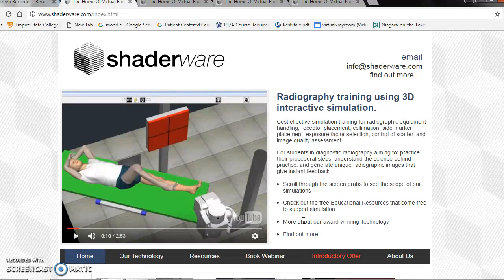software. We are going to do quite a few things today regarding X-ray images. The three that I'm going to cover today are movements, image evaluation, and acquiring an image. So to begin, we're going to start with movements. All right, so we're going to start with table movements, which I'm going to show you right here.